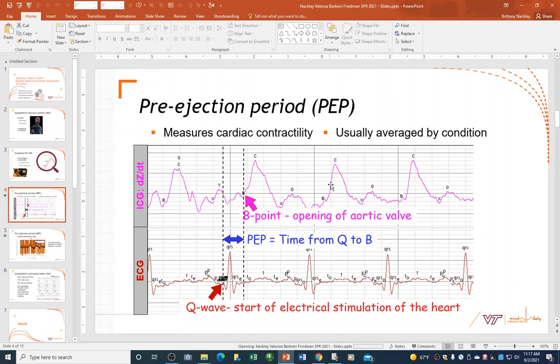It has a similar rhythmicity to the ECG signal. We can see from this R spike to R spike is one heartbeat. This is a similar cardiac cycle. It's just on an off phase part, kind of in the middle of one heartbeat to the middle of the other. So this is still the same cardiac cycle, just different relevant points in it.